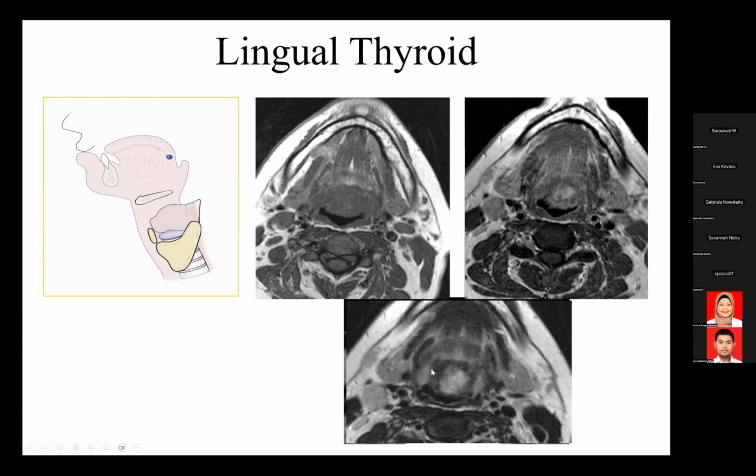So again, to me, this is a non-specific finding radiologically. I would just say that there's an enhancing mass in the middle of the tongue base. Maybe because it's located in the foramen cecum, I would raise that possibility, especially in a child. But certainly if I saw this in an adult, the most common thing that would come to mind would be squamous cell carcinoma involving the region of the foramen cecum.